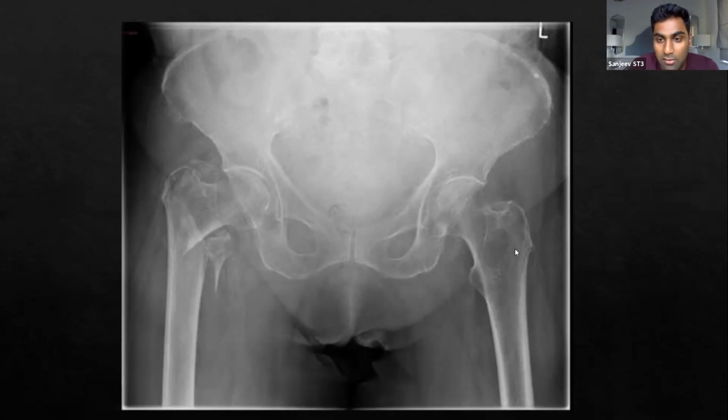So the trochanters, this is the lesser trochanter and this is the greater trochanter. And if there's a fracture going through here, which is exactly what's happening on the right, you call it an intertrochanteric fracture, which is an extracapsular one. If you can put both those phrases in, that's really good, and it shows the examiner you know exactly how to describe hip fractures. The reason I put these two cases is these are the two that you're realistically going to get: an intracapsular, like the previous case which Aaron presented, or an extracapsular intertrochanteric fracture.